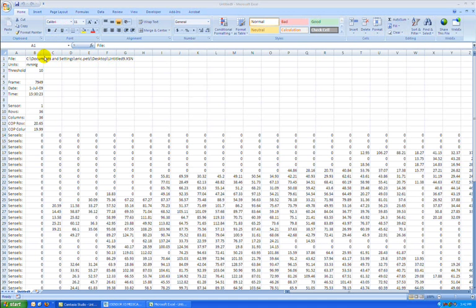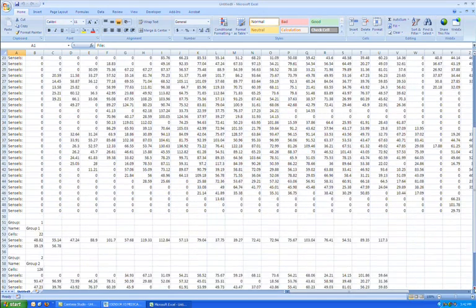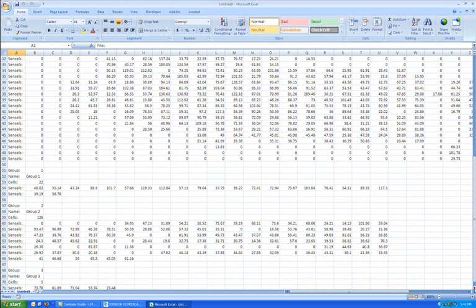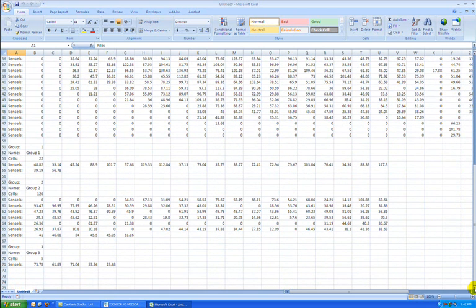Here I can see the file name, the units, the lower threshold, and the frame that I looked at, and I'm able to see the pressure measurements from each cell that I defined. If I move further down the graph, I'm able to see the group data, so I can see the individual pressure cell data from each of the stencils in the group. And therefore I could run analysis on all of them and see in what patterns they occurred.